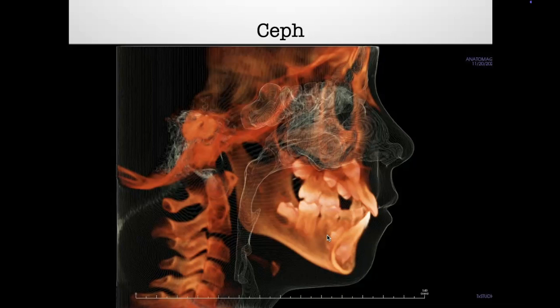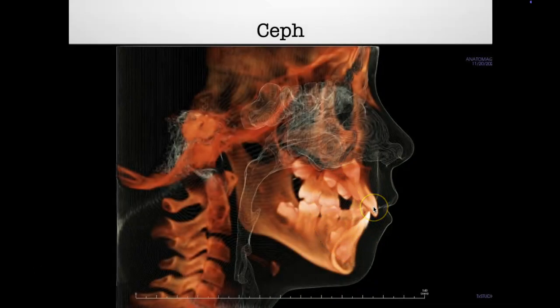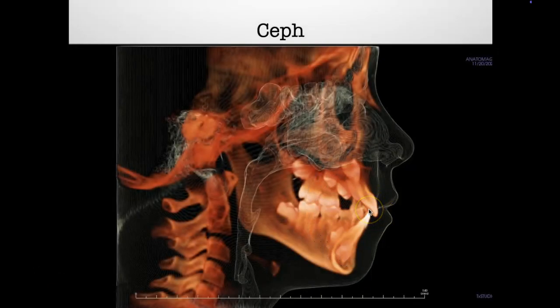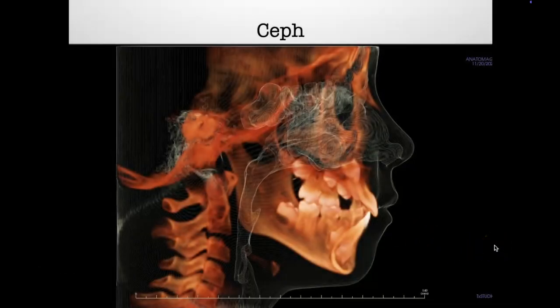What's ideal? As it relates to the facial surface of the maxillary incisor, what's ideal? Yeah, pretty much straight up and down, right? So you can see here, just slightly proclined. If these were uprighted maybe a millimeter and a half, those central incisors would be pretty upright. All right, what else do you notice on the Ceph? Good, bad, or indifferent?